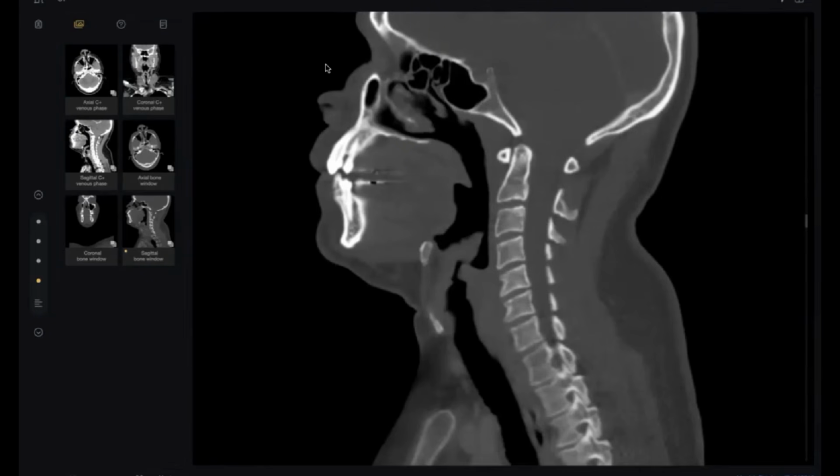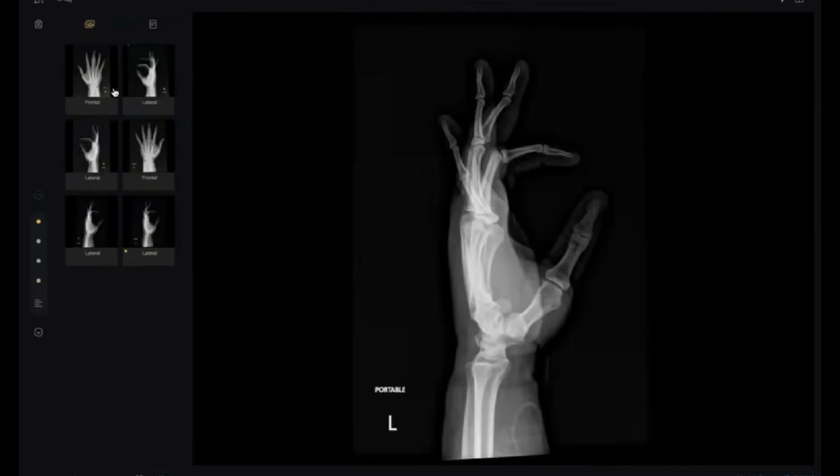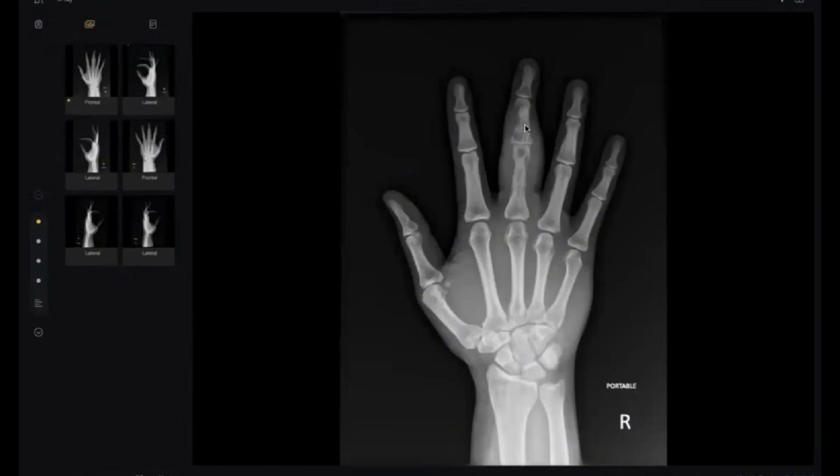Somebody asked about the hand X-ray, that it looks like TB dactylitis. Not at all. Why? TB causes something called spina ventosa. What is spina ventosa? The phalanx or the bone is markedly expanded, the bone itself, not the soft tissue. Search Google or Wikipedia for TB dactylitis or spina ventosa. Very different from this one. Okay, my colleagues.